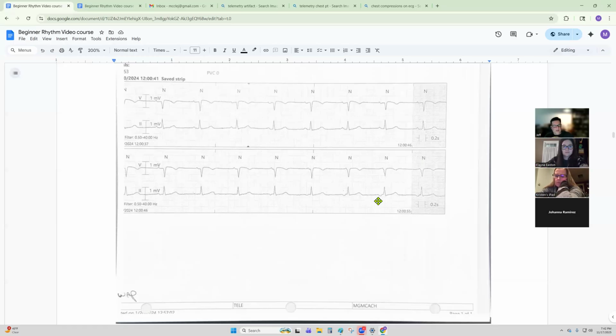Again, splitting hairs. You can call it junctional, whatever. It's not sinus anymore. That's the big thing.